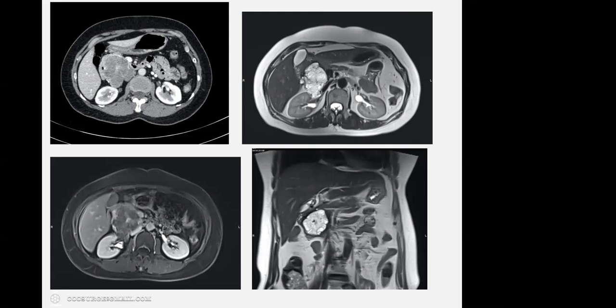Yes, sir. Head of pancreas. Yeah, it is not an adenocarcinoma. It is a cystic lesion. I told you this on the T2 weighted image. So it is a cystic pancreatic neoplasm, and it is actually microcystic. Multiple microcysts are there with a central area of fibrosis, tiny calcification. So this is serous cystadenoma. Okay.